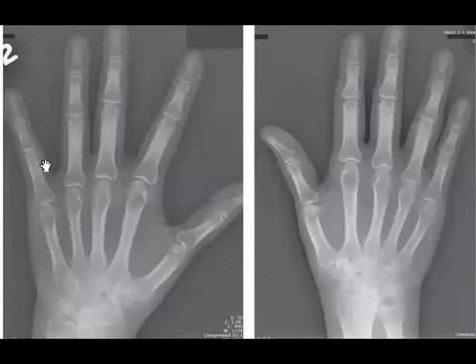Perfect. And if you go to the joint space, do you see any narrowing or loss of joint spaces? Yeah, Justiana. So yeah, there is something in the carpal bones. Yes, in the proximal. So when you find proximal joint space narrowing, you will suspect, I see that Justiana said rheumatoid arthritis, doc. Yes. So again, you are going to search for one of the commonest causes. It will be rheumatoid arthritis.